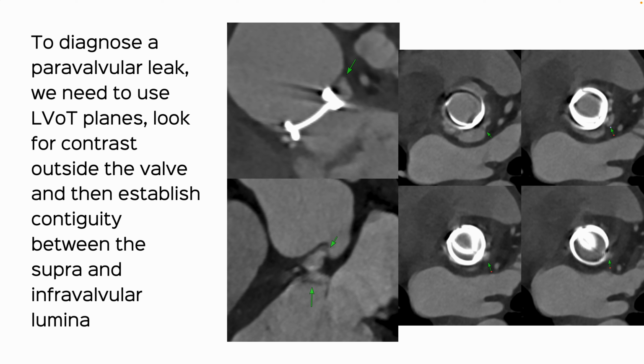So this is just a technical thing about how to diagnose one, as and when and if and when you get a case and you're reading cardiac CTs, etc.